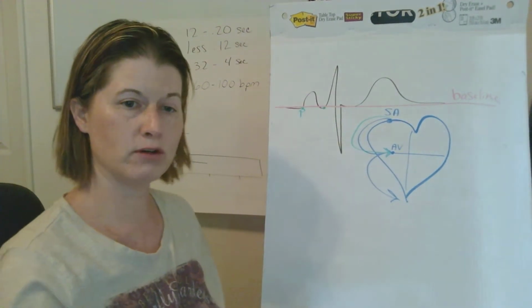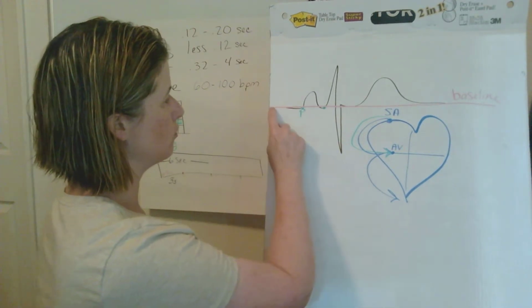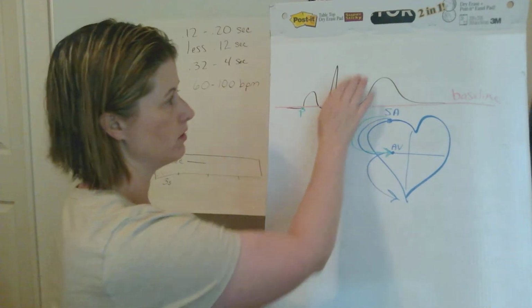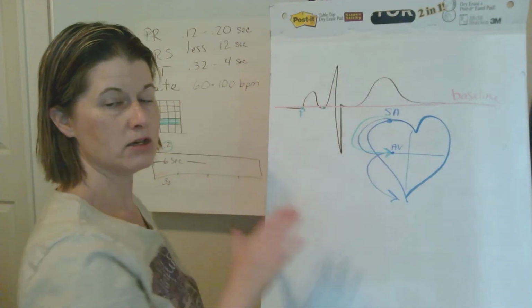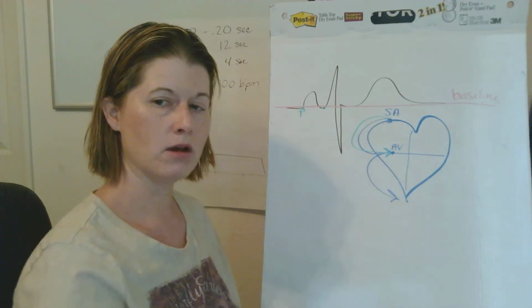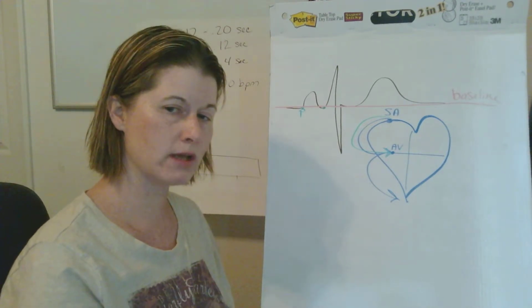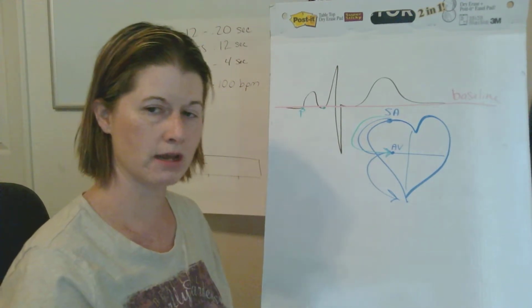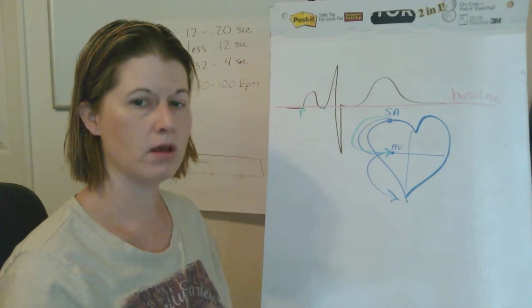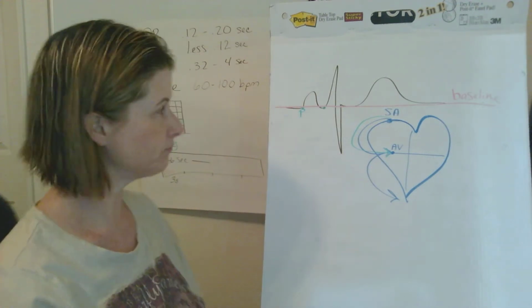When you're first starting out with your EKGs or you're refreshing, your baseline is where your P's start, where your QRS's start, where your T's come back to, where everything starts and comes back to. You might want to draw a colored line along it when you're getting started. So if you're trying to figure out where your QRS starts, where your T starts, you're looking at where it leaves baseline, where it starts to go up, or where it returns to baseline. That's where you stop measuring, okay?